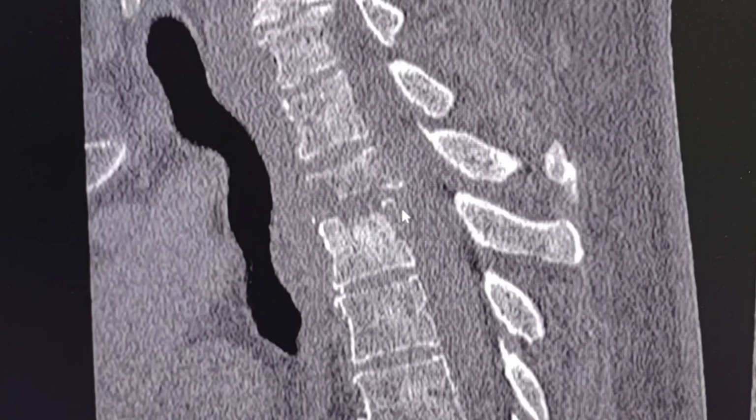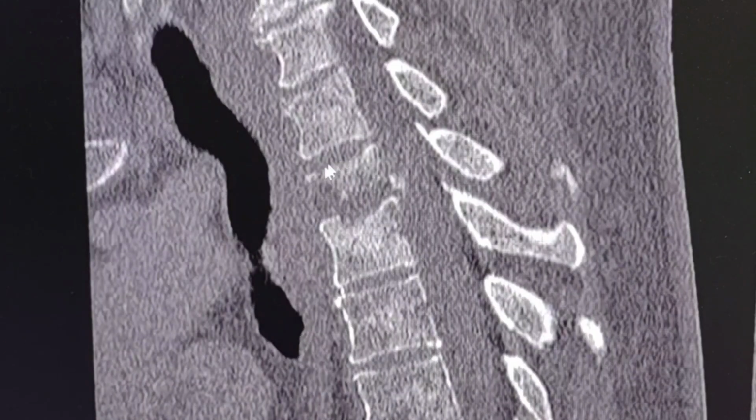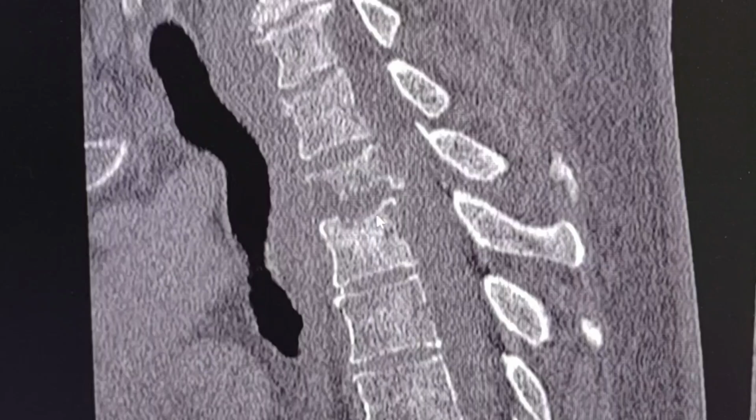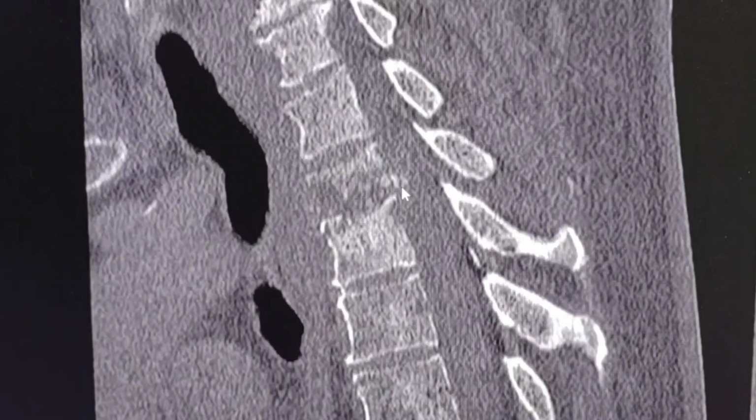This is the MPR image in sagittal view, and we can see the T2 vertebra, and the T3, the collapse, the deformity, particularly in the lower end plate. There is some inhomogeneous hyperdensity of the T3 vertebral body, erosions as well in the upper end plate of it, the retropulsion, the spinal canal stenosis.